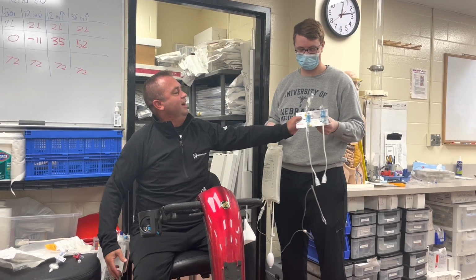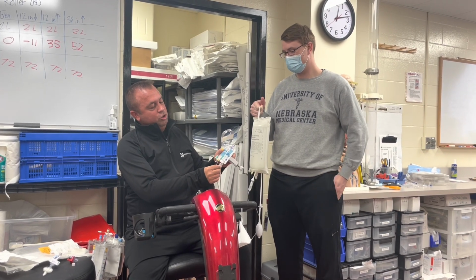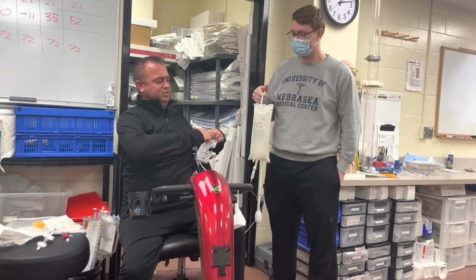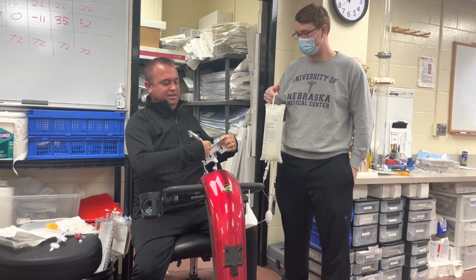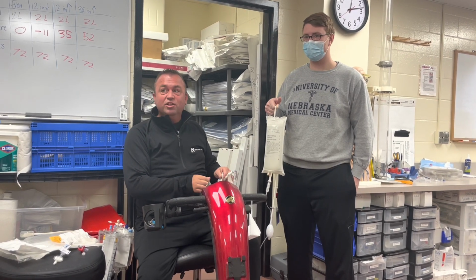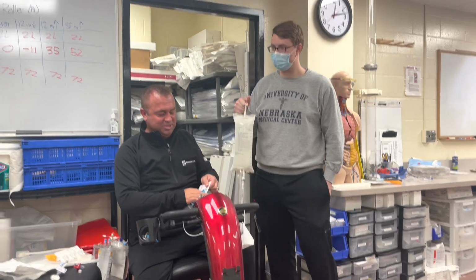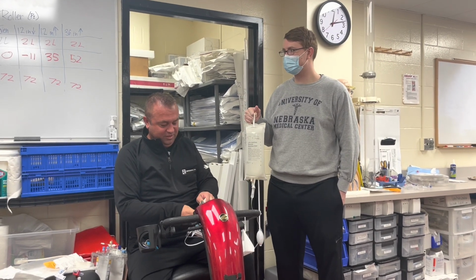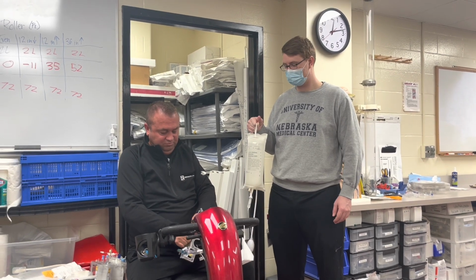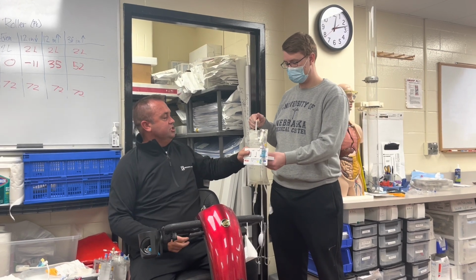So what we'll do is, since we have another one right here, we'll move this over and use this other one. I think we should probably also throw that one away, just so when we get to pig labs and have blood. Should we leave the last class? Leave the next? Yeah. Let's not. Let's throw this one away, knowing that we are eventually going to have some blood in that one, and we don't want to get that. So now we're ready to go.